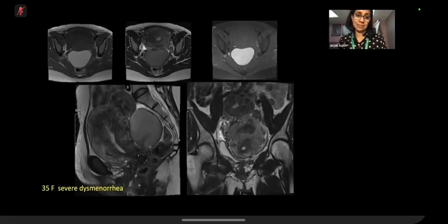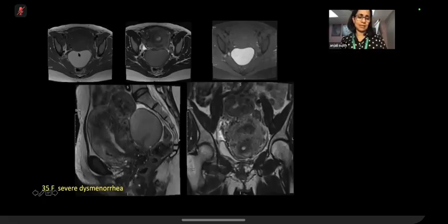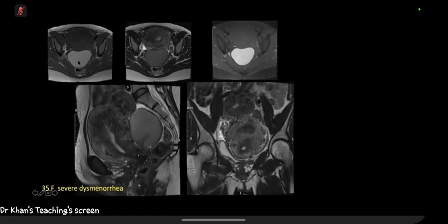So yeah, have a go at this case. Again, I've got multiple slices of the MRI for pelvis. So the first is a T2 because the urinary bladder is bright. The next, on which I can see there's a bulky uterus. This image. Yes. And this is a posterior structure that is in the pouch of Douglas. So this cannot be bladder. Oh no, this can't be bladder, sorry.